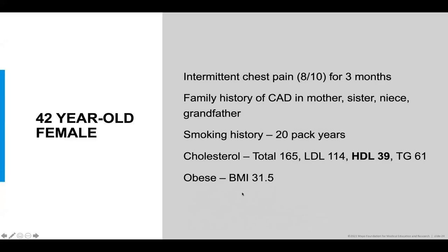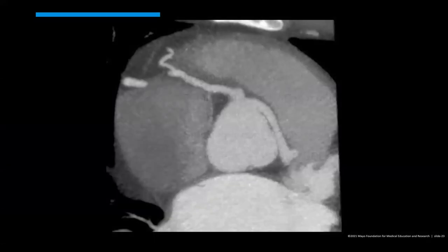How can we differentiate between interarterial versus subpulmonic course? Good question. Some of these anomalous lefts come off and then dive down and go through the septum, and others might just go along the septum but not be quite in between the aortic root and the main pulmonary artery.